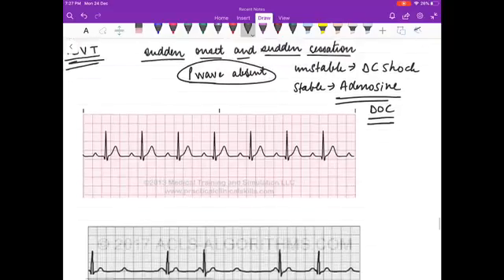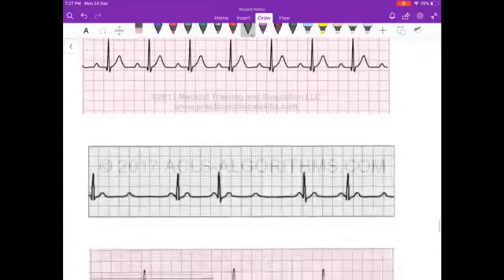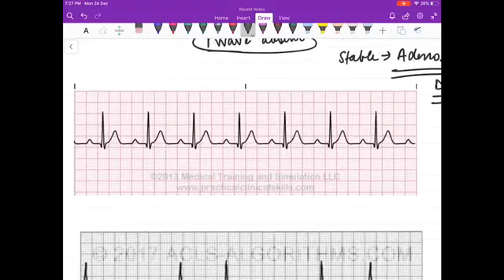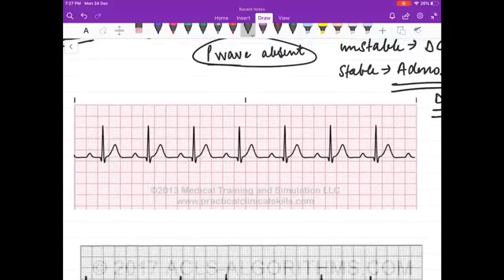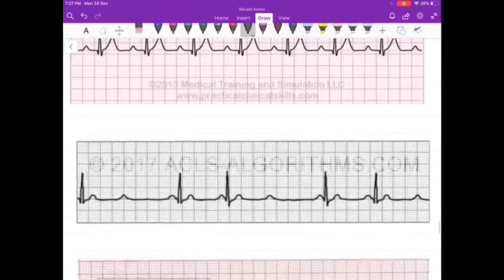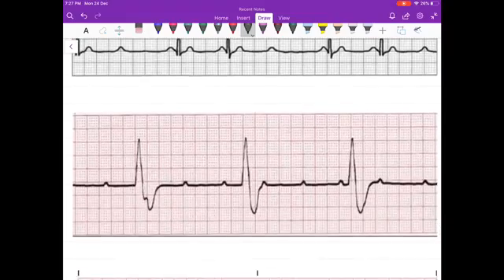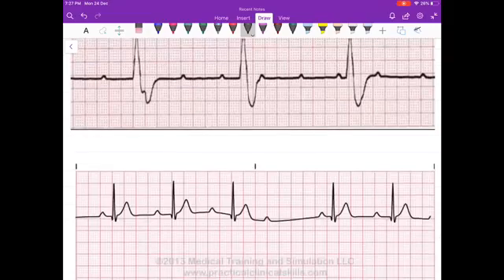Okay. So now friends, you will identify the ECGs. So in this I will show you all the ECGs together. You can pause the video, and then in the end I will give you the answers. So identify this ECG. You can pause the video. You can see the answers later on.